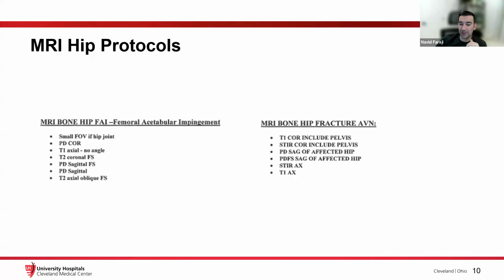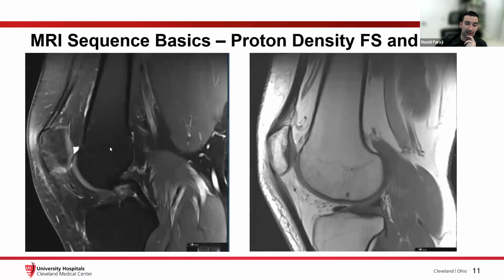So we're more likely to catch incidental findings on this protocol on the right than we are on this protocol on the left. And it's just much more likely that these older patients are going to have important incidentals and contralateral hip pathology than in this younger patient population.